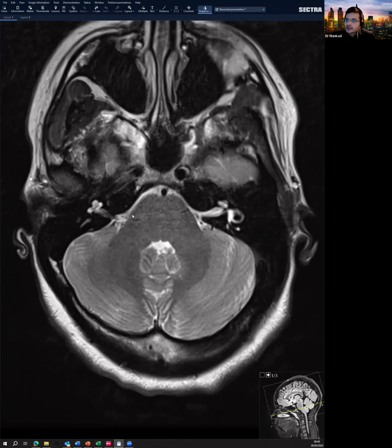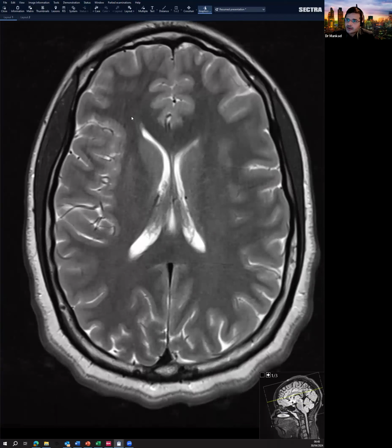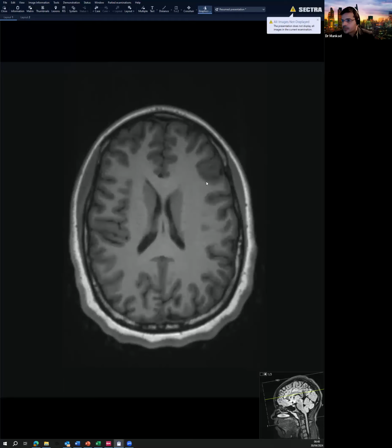And bring in another sequence. So now, once again, before we move on, if the white matter appears dark, then it's a T2 weighted sequence, and it's an axial T2 when the CSF is bright. Let's compare that with this sequence.